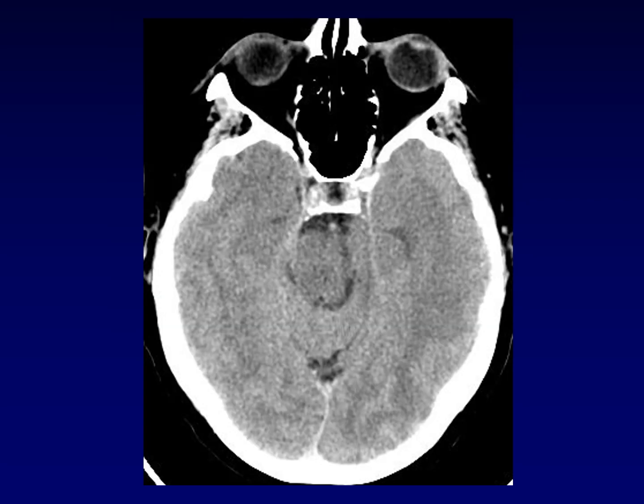Here's something that can go wrong in the brain when there is a mass or something else causing a mass effect within the temporal lobe. The medial portion of the temporal lobe is called the uncus, and that uncus should be along the lateral aspect of the tentorium cerebelli, which is right here.